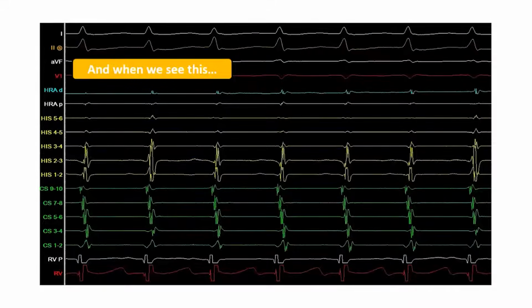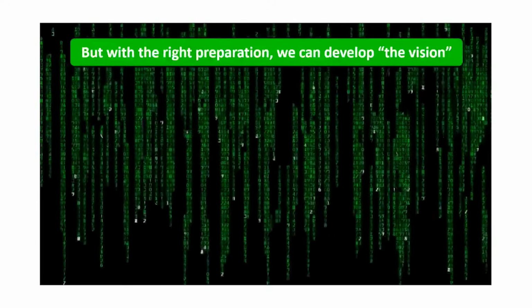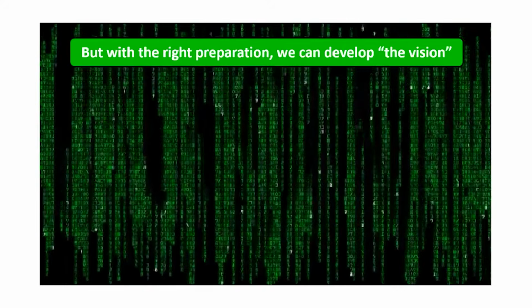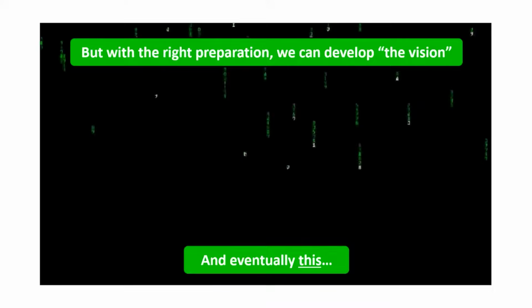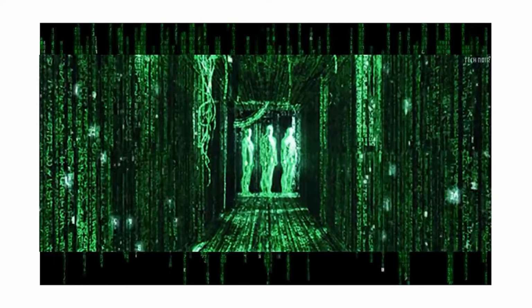And when we see something like this, it can feel like we're looking at this. But with the right preparation, we can start to develop the vision. And all of a sudden, all the signals on the screen can actually start to paint a picture. And that can turn into this.